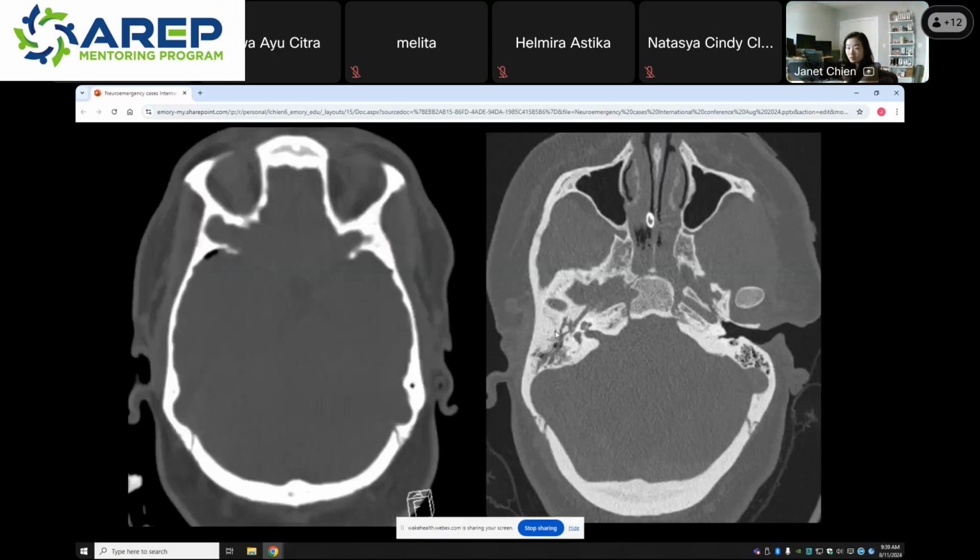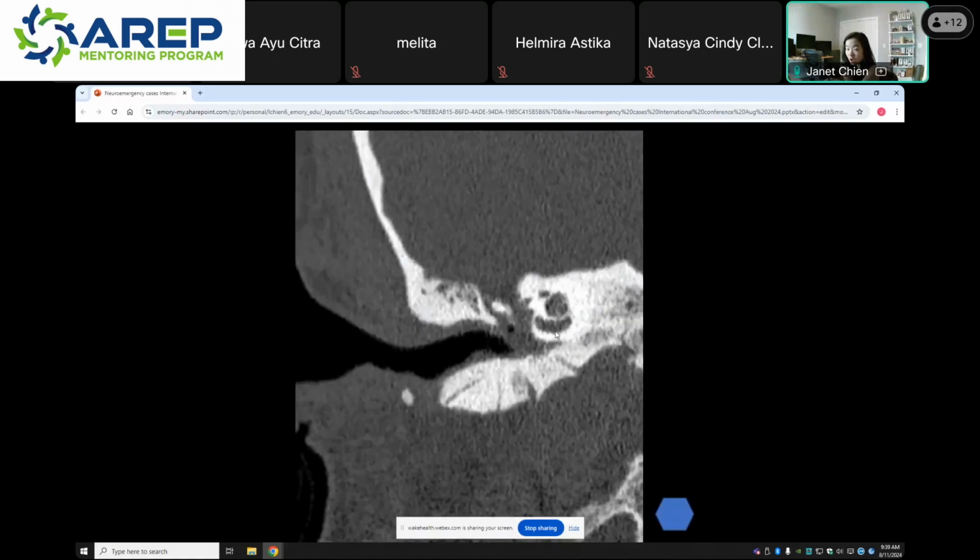So this finding, the pneumocephalus, the abnormal bony erosion, and middle ear mastoid effusions in the setting of fever, ear pain, this is very worrisome for complicated acute otomastoiditis, right? So coalescent otomastoiditis with probable intracranial extension, right? It's the air that you're seeing along the anterior middle cranial fossa, that's air from the middle ear and mastoid air cells. It's now directly communicating with the intracranial compartment. Any questions about that so far?